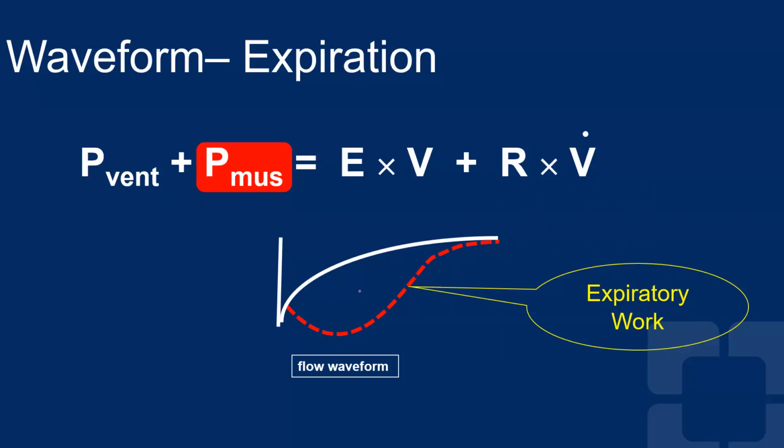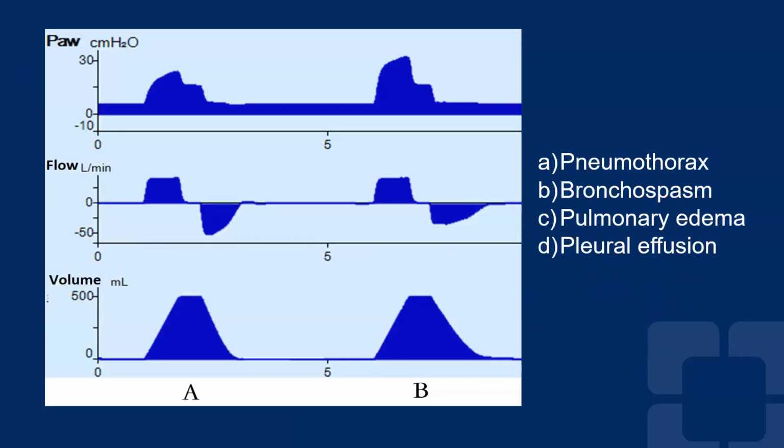So this patient has a catheter placed in the esophagus that is measuring the electrical activity of the diaphragm. This is useful in this mode, which is NAVA. The software will show the EDI, the electrical activity of the diaphragm, on top of the pressure waveform, showing you the estimated pressure that it would deliver if you had the mode active. What this is useful for us is that now we have a representation of the electrical activity of the patient right here on top of the pressure waveform.